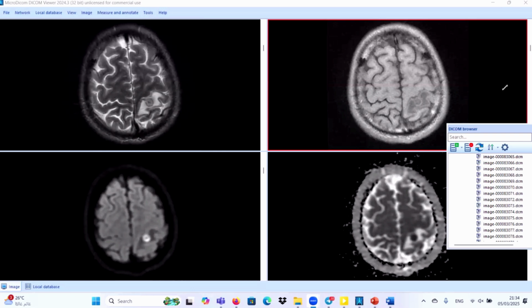The left high parietal region is the seat of a small, well-circumscribed space-occupying lesion having a subcortical location. The lesion shows a smooth border, as you see. The lesion displays iso-intense signal intensity in the T2-weighted image, and its core displays a dot of dark signal. In the T1-weighted image, it is characterized by high or relatively high signal intensity along its border.